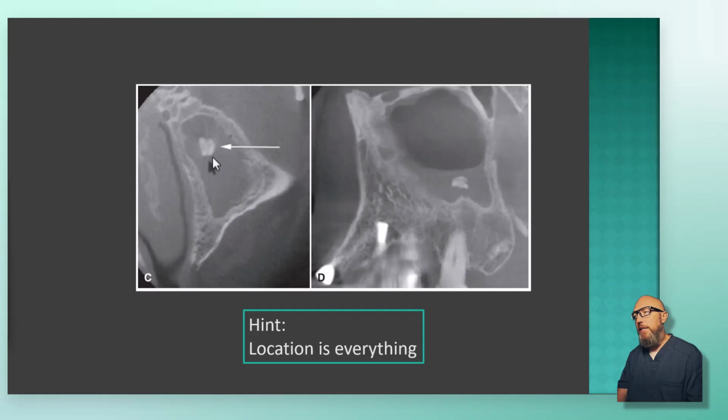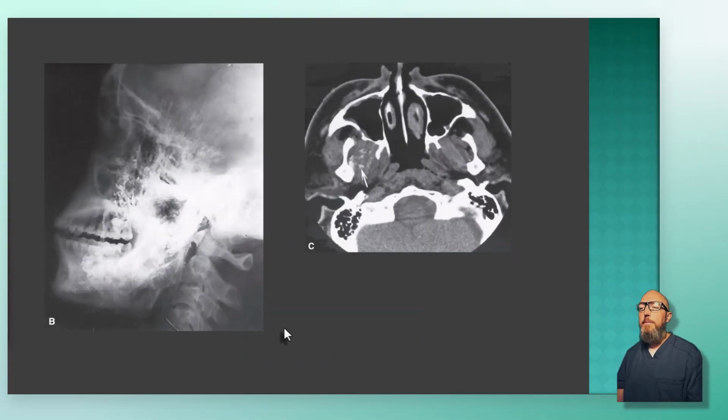And so this calcification is within the sinus. Here in the more coronal view, you can appreciate there's a fluid level, but there's this nidus of calcification inside, so there's an antrolith going on. I like this one, mainly because the striating pattern kind of tells you everything.